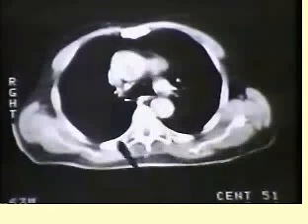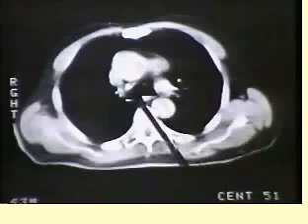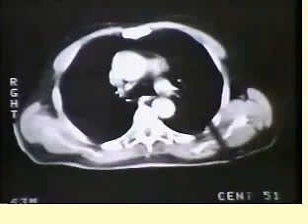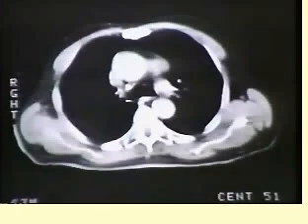Here's the ascending aorta. Notice that on this cut, you cannot actually appreciate the origin of this aneurysm from the ascending aorta because it is bulging upwards from its actual origin, which we've just seen. What's this shadow? This other mass shadow within the AP window? That's the top of the left pulmonary artery. That's the normal structure to see in that region.